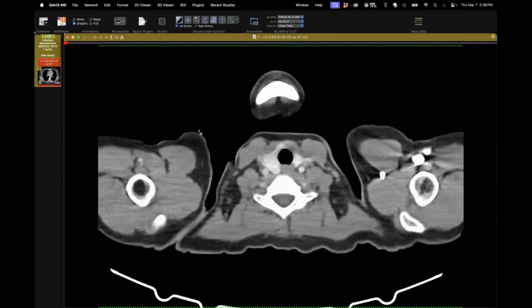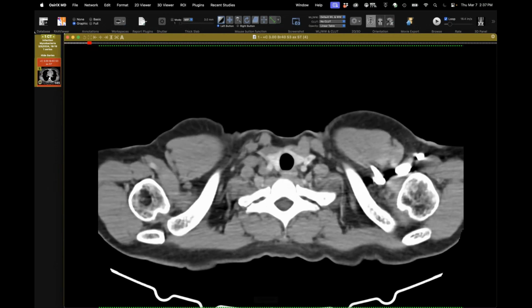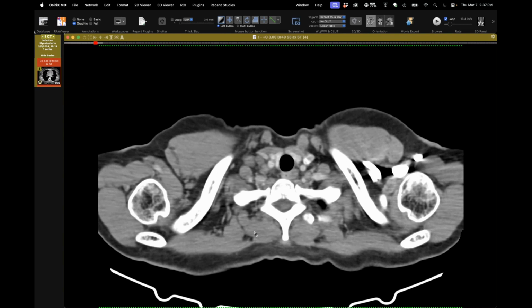So this is a young patient that presented with cervical lymphadenopathy, and you can see on this chest CT. You're not seeing my screen? No. Yes. I see it. How about now? Do you see it? A CT? I do. Now we do.